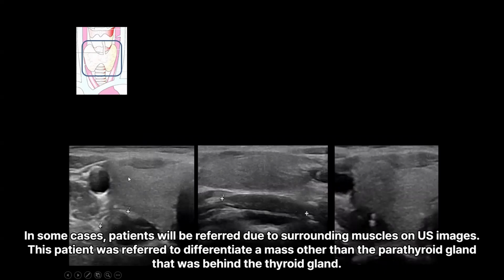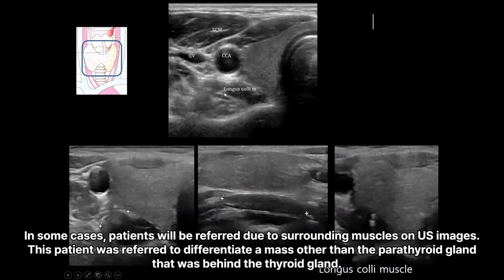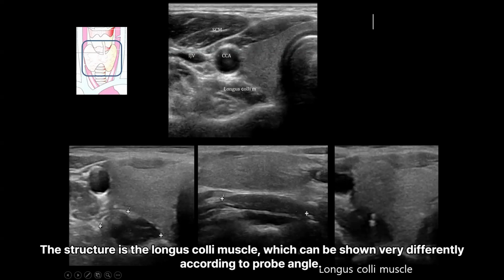In some cases, patients will be referred due to surrounding muscles on US images. This patient was referred to differentiate a mass other than the parathyroid gland that was behind the thyroid gland. The structure is the longus colli muscle, which can be shown very differently according to probe angle.